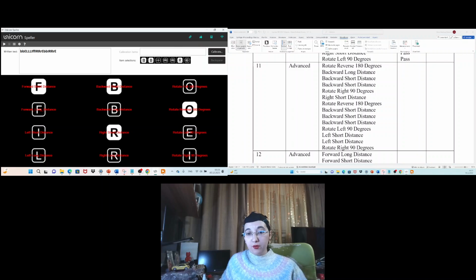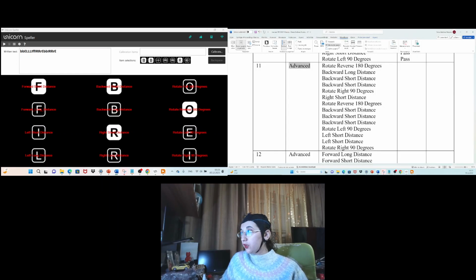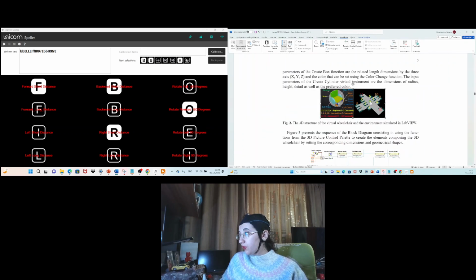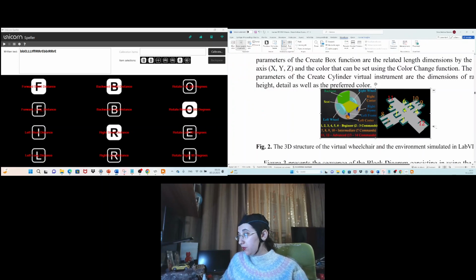Okay, backspace, I will remove these commands. Then here reset. So these centered locations were reached, and now we have 11 and 12. Let's check again. So here, yes, here is 11. As you can see, 11 and 12.